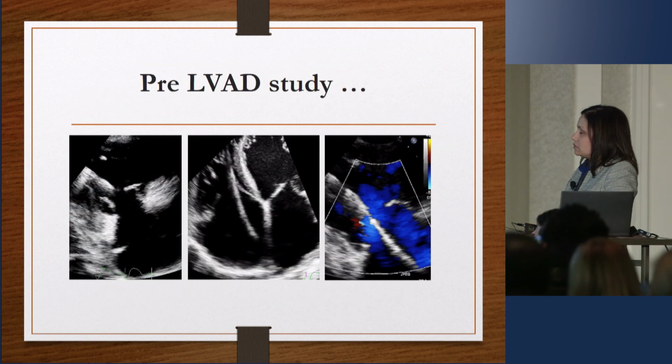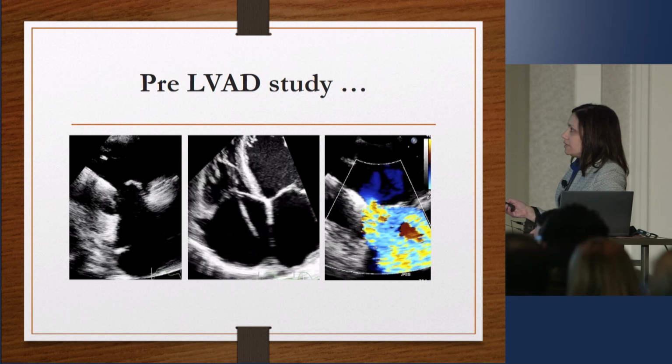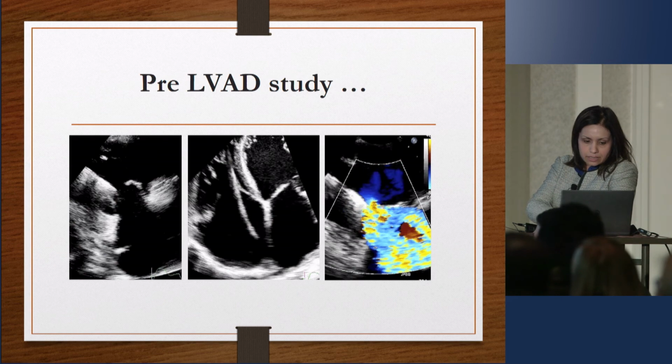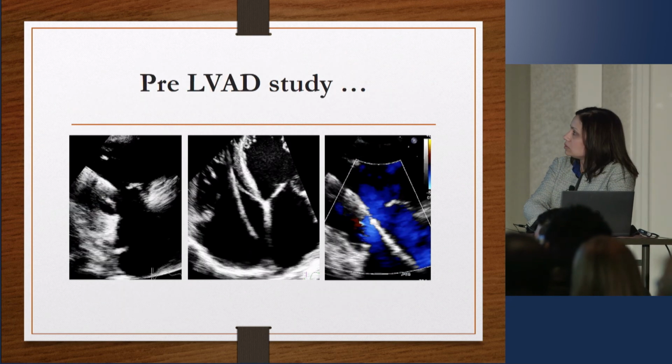So this is a case of a patient at our institution who was going for an LVAD. Now, with these LVAD patients, it's important to determine whether or not they have tricuspid regurgitation. And you can see here, now this one was playing but hasn't, I think it's important that it plays, so I'm just going to move back 1 slide and move forward again. Oh, it won't play.